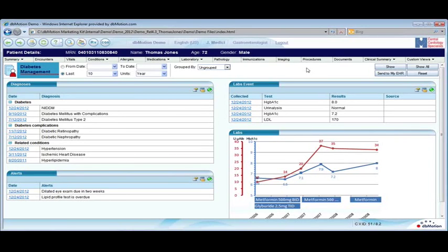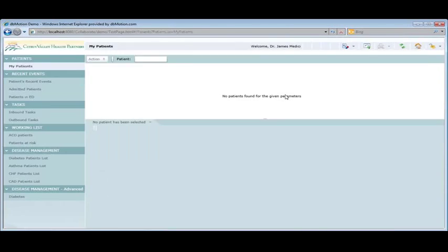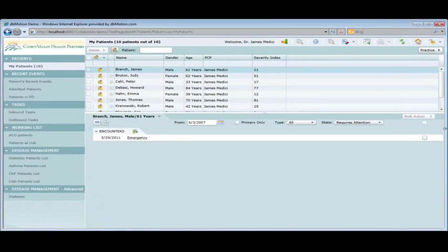So I'm going to go ahead and switch to the population health view again, and then we'll come back to that agent that we saw in the beginning, unless people have any other needs to see any other detail here, which I'll be glad to show them. So I'm going ahead and clicking on what we call Collaborate. The name will become important in a second here.